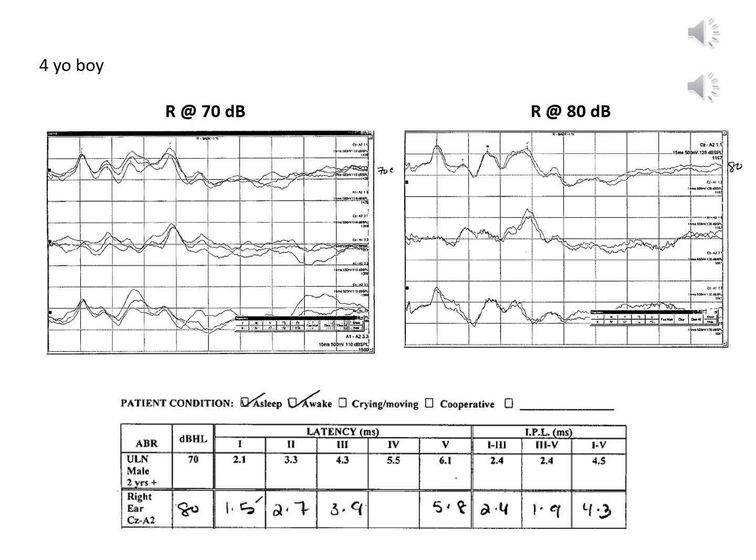You should also recall that over 2 years of age, there's a sex difference in the upper limits of normal values between boys and girls. And so this is a 4-year-old boy, and so you'll notice in our values at the bottom, we're using the upper limits of normal for males 2 years plus. If this were a girl, then we'd have to pull the page for females.